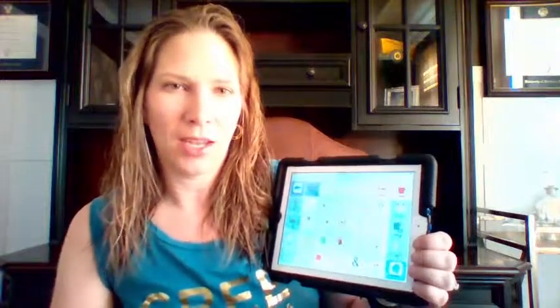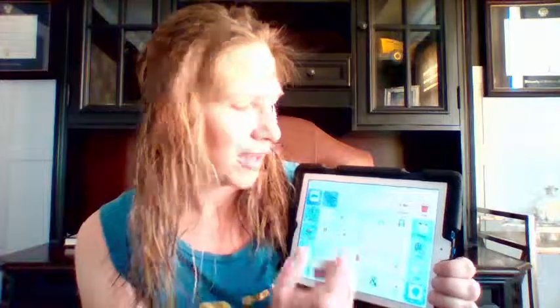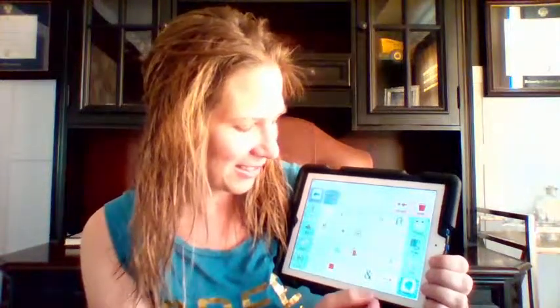Sometimes you'll find children maybe perseverating and typing in really long messages and then listening to it over and over again, so teaching them to clear it. It also has the option which is called Rub It Out, which just deletes the last word. If I didn't mean to press the word fast, but I meant to press the word slow, I can then just delete that one word. Look at that. "I am loud. I am quiet." Being able to describe things in a more thorough way.